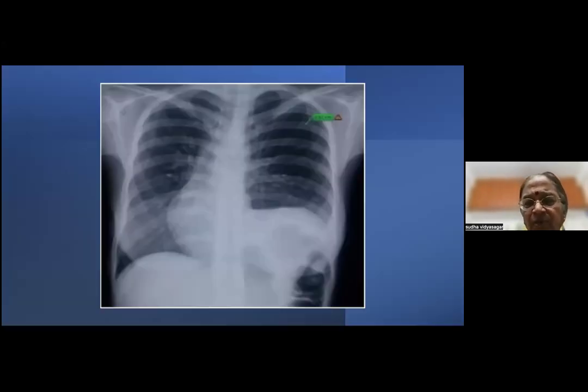Now, the last few X-rays. What is this one? Dextrocardia, correct. It's a dextrocardia, okay? Not a right diaphragm palsy. Please remember, this is a dextrocardia. The heart has come over here. Look for your stomach shadow. Probably it is on this side. If so, it's a situs inversus. And of course, why is this diaphragm high? That we don't know. We'll have to think about it, but we can't straight away call it a diaphragmatic palsy. It's probably a dextrocardia. No, there is no hydropneumothorax.